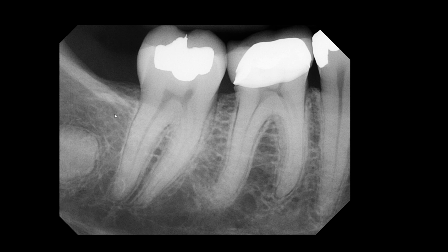So you need to look at the overall cortical and trabecular bone of this area, and we know from normal anatomy that this area tends to appear very radiolucent, not only because of large marrow spaces but also because of the submandibular gland fossa that's present in the posterior mandible. So here we see a very well-defined radiopacity surrounded by a thin radiolucent rim. And that is very important to see. So when you see this, what are your possibilities? I mean, what are you thinking, right?